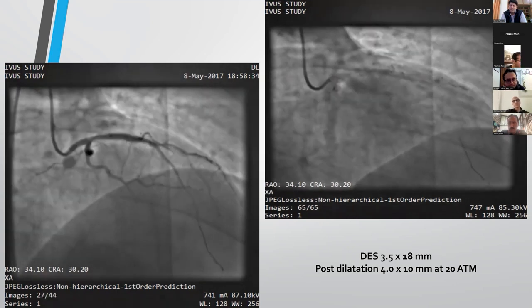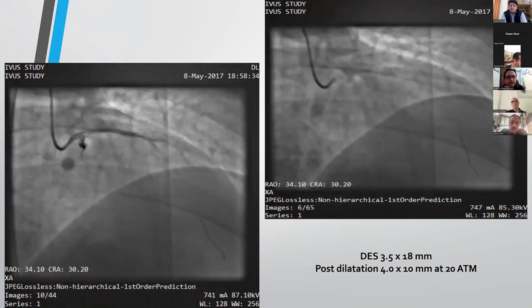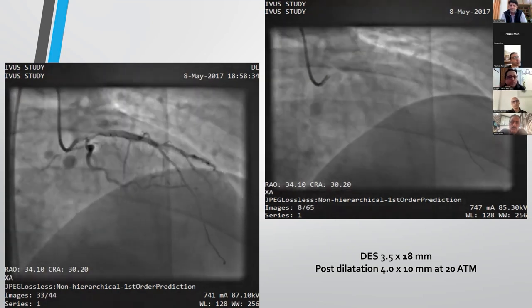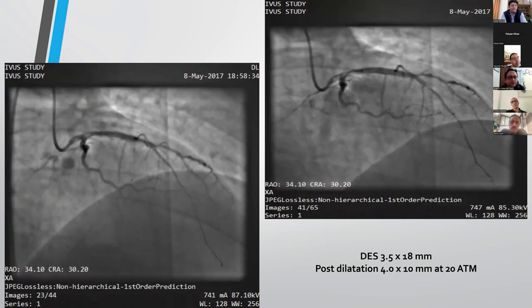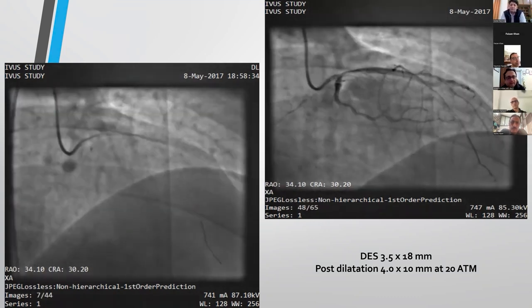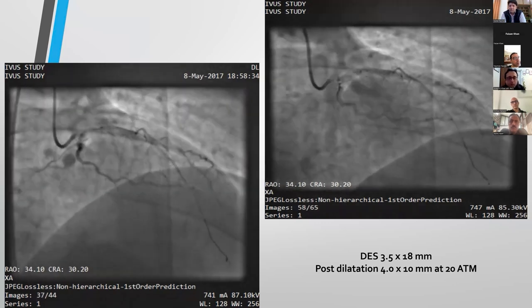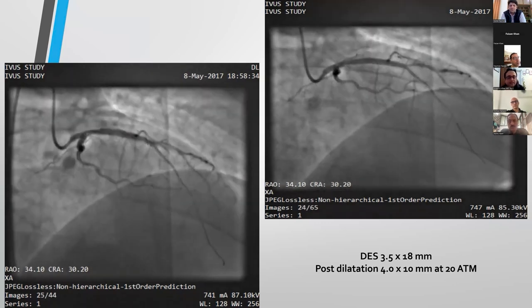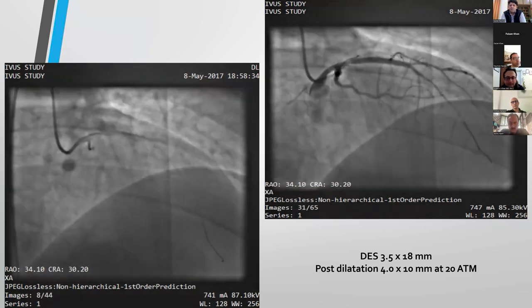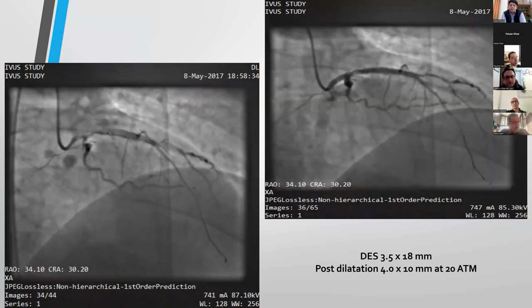Asad, I think what Usman is trying to say is that once you had done an NC balloon on that 2.5 stent, before you put in a new stent, you could have done an IVUS to see if there is stent fracture or not, or if your original stent has expanded enough or not. Because we know that even third generation stents, anything below 3.0 doesn't go up to more than 3.75, and that's where your point becomes valid, that there is a high likelihood of stent fracture.